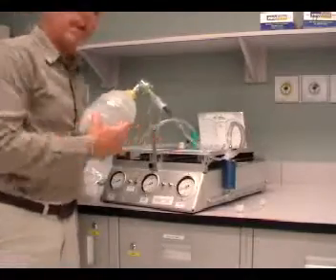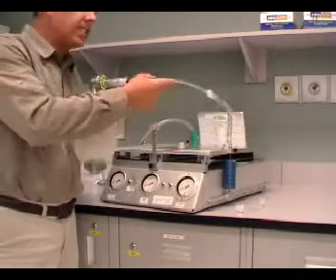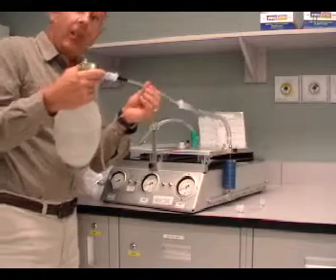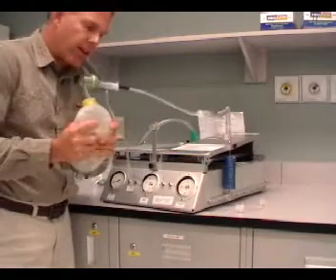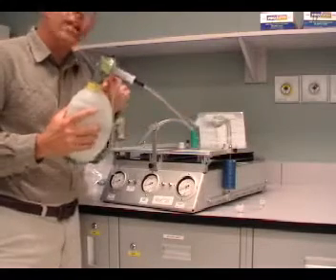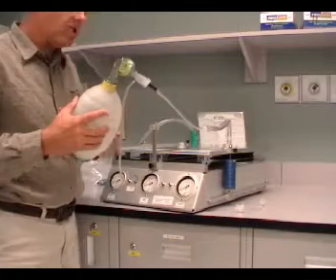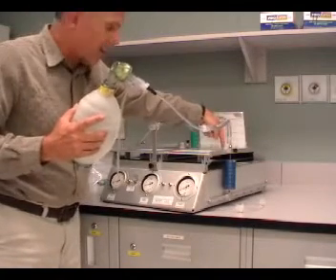Resistance is the force or the pressures required to overcome the small diameter, or the resistance, of the endotracheal tube in this case. It requires pressure to create flow. I have to have a pressure gradient, and the pressure gradient I'm talking about right now is the pressures at the mouth and the lung. So I need a high pressure here to deliver pressures into the lungs.